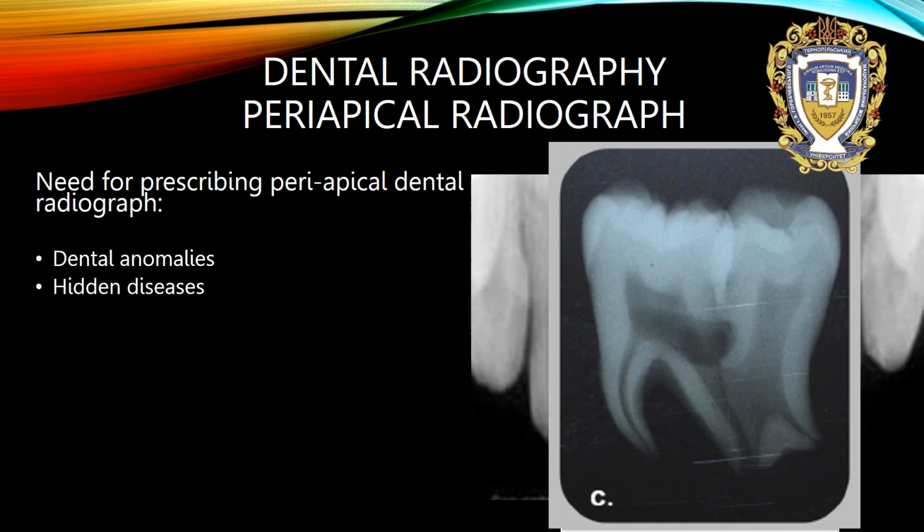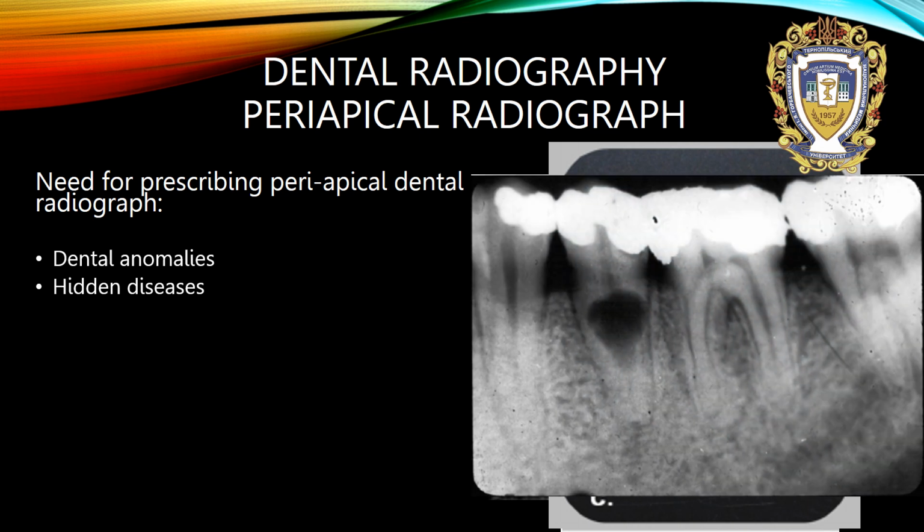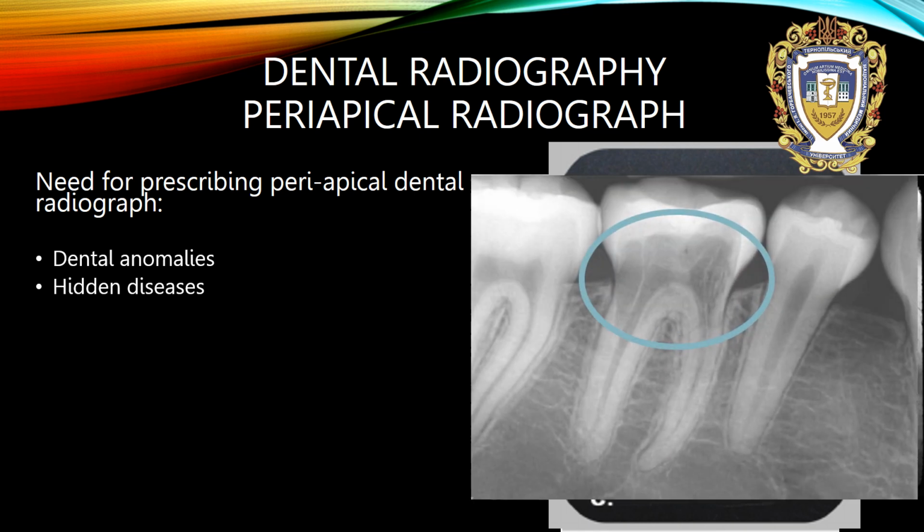Hidden diseases, like internal resorption. You can see, we can observe resorption of dentine, and we cannot find it without X-rays. Or another pathological situation, internal resorption too.